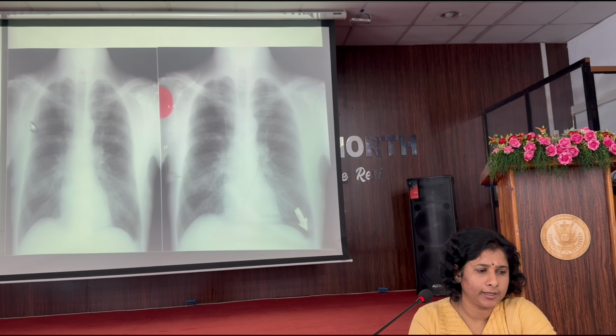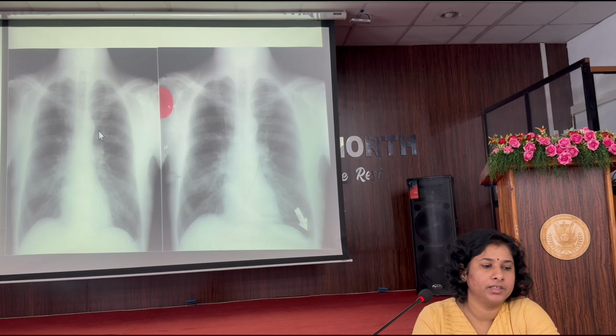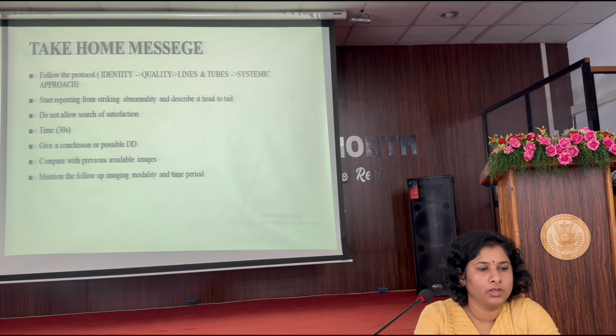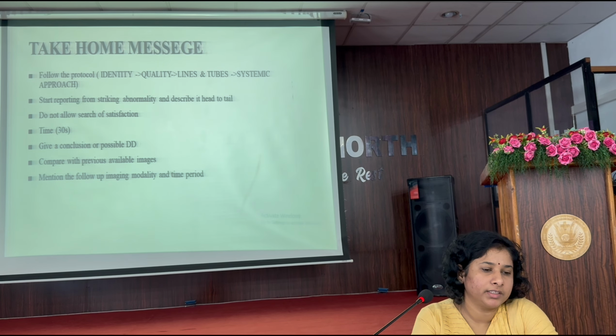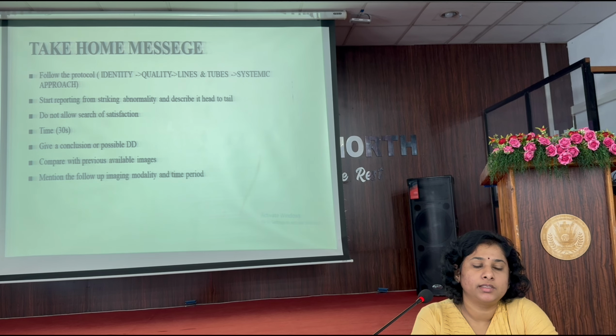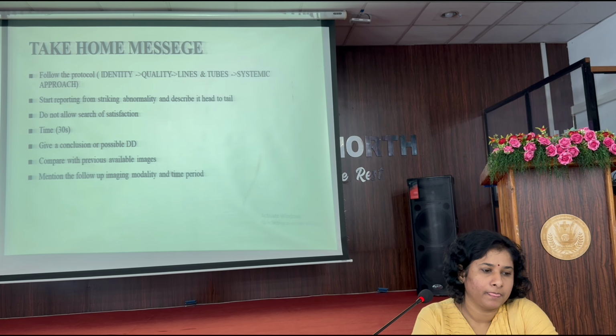Here, the humeral head is infiltrated due to the metastasis, right? So the take-home message is: follow the protocols, identify the X-ray, do a quality assessment, assess the lines and tubes, go through the systematic approach, and come to the conclusion.